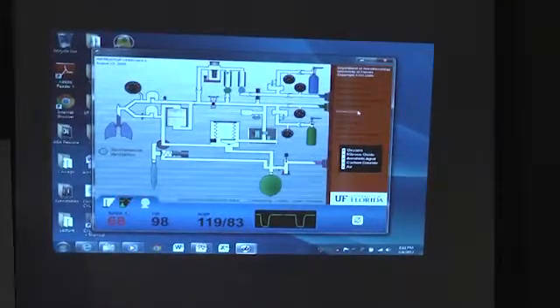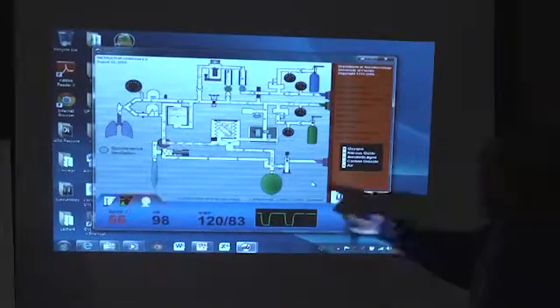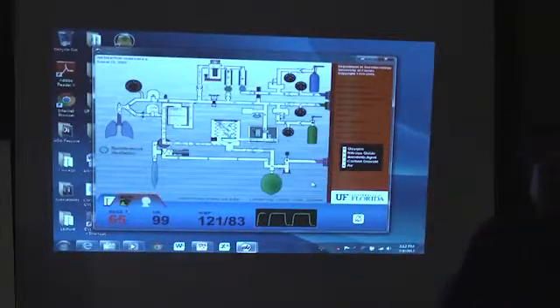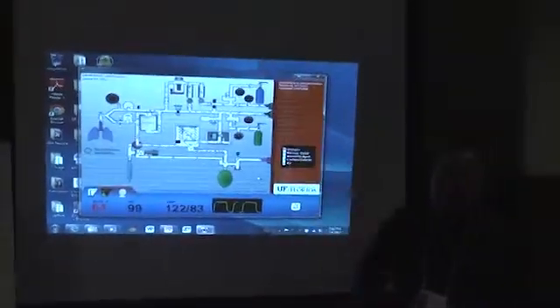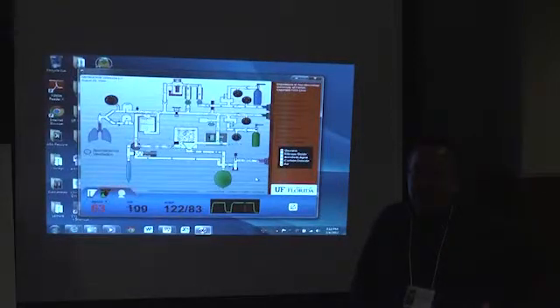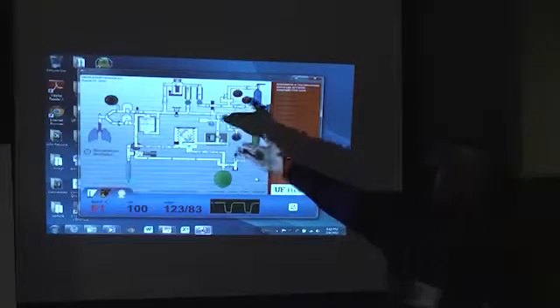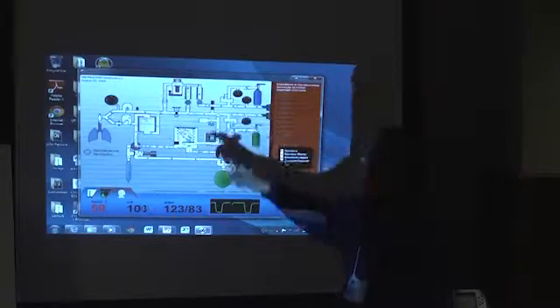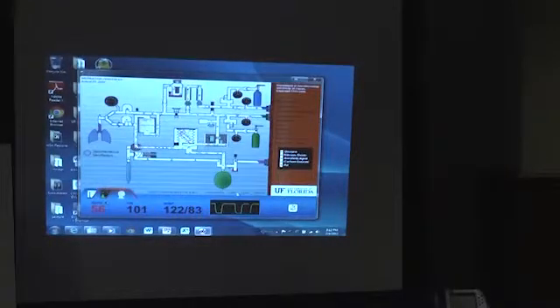So before we do that, have you been talking to your colleagues, or did you already know that? When you come here, here's the cylinder. What's the pressure in the cylinder? What's the range of pressure? From 2200 to 40. Then it gets regulated down by this pressure regulator to what pressure? To 40. And what is the pressure in the pipeline?